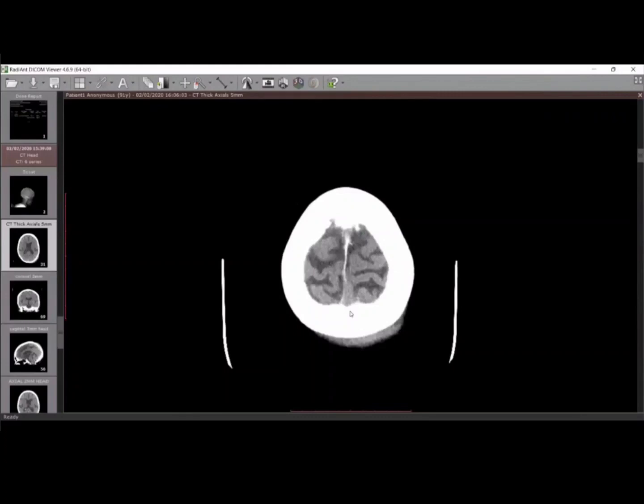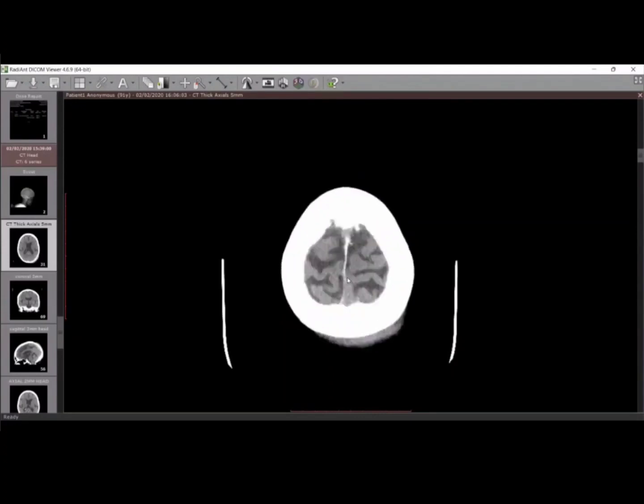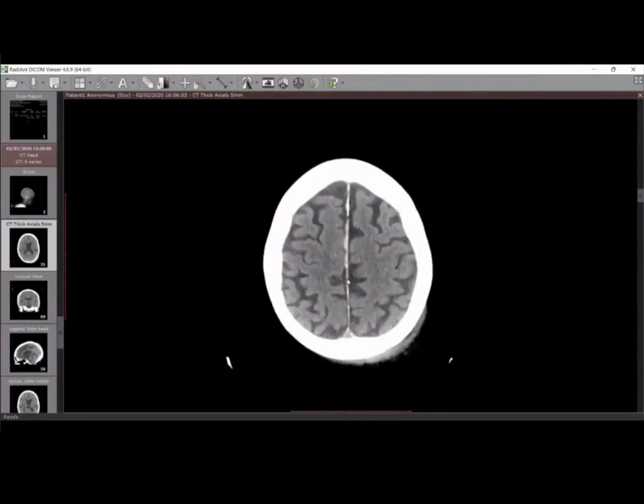So while I trace it posteriorly in the region of the superior sagittal sinus, the density is different. But anteriorly, it looks hyperdense. And it's perfectly midline. So I am a bit debating whether this is incidental falx calcification or this is acute hemorrhage in the region of falx in the midline. Right.